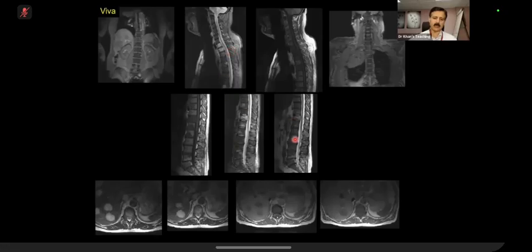So this is in keeping with metastasis. But then on the available sequences, you can see multiple lesions in the liver. So metastasis there. And then on the scout, you can see that there is a lung carcinoma, which means that is the primary. So always look for multiple findings.